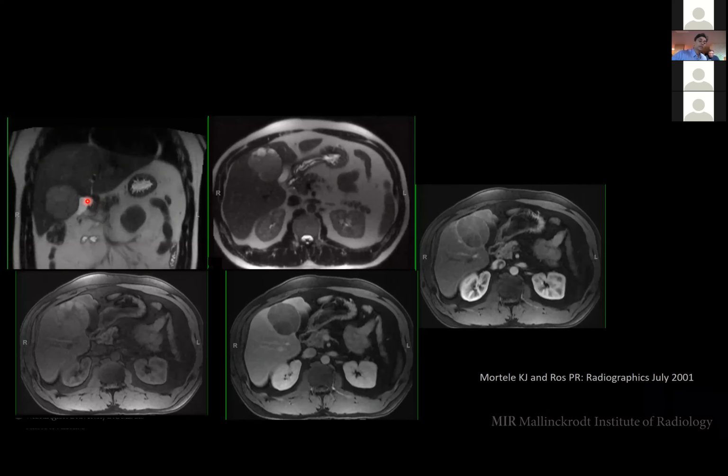Another case, a cystic appearing lesion. Why am I saying cystic here? So it looks like it is slightly hyperintense. It's not clearly as cystic as the gallbladder fluid. If you look at it in the transaxial image, there are some components that are showing bright, other components are not. When you go on to T1, the reason the lesion is not looking very fluidy bright is because on the T1 weighted sequences, there is some proteinaceous material or hemorrhage. That's why it is not looking fluidy bright. It's not looking like gallbladder. It is not looking dark like gallbladder.